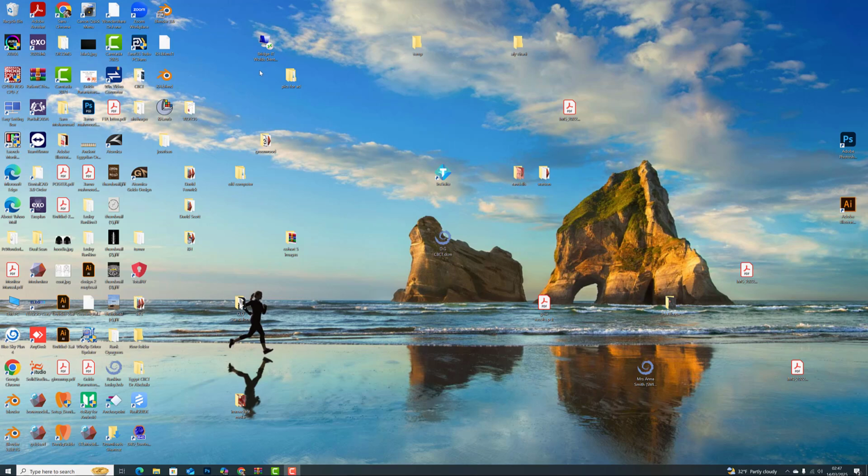Hello everyone. Another video of digital implant planning using different softwares. The software that I'm going to introduce to you today is the Tru Abutment software called Pylon. Tru Abutment has a suite of applications, and these applications have different functions. Pylon is the implant planning software.